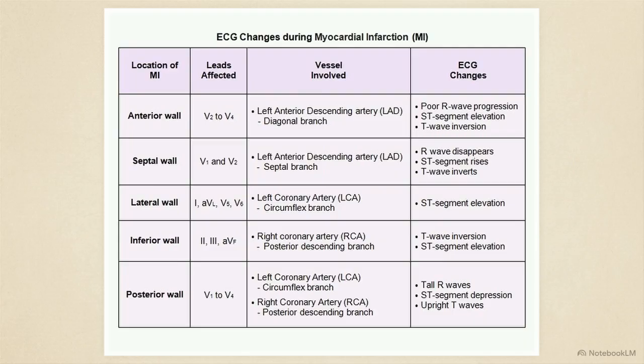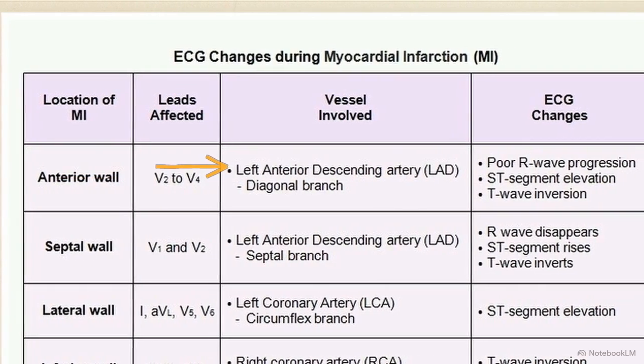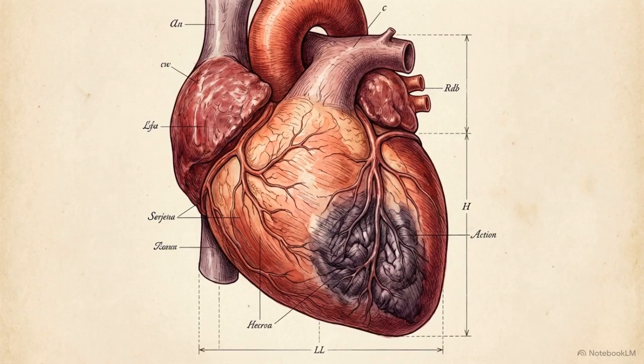Step 10 involves scanning for ectopic beats and evaluating ST elevations. This chart breaks down how specific leads act as a targeted map, pinpointing exactly which vessel is blocked during a myocardial infarction. Completing these final steps allows you to identify active physical tissue death in real time.